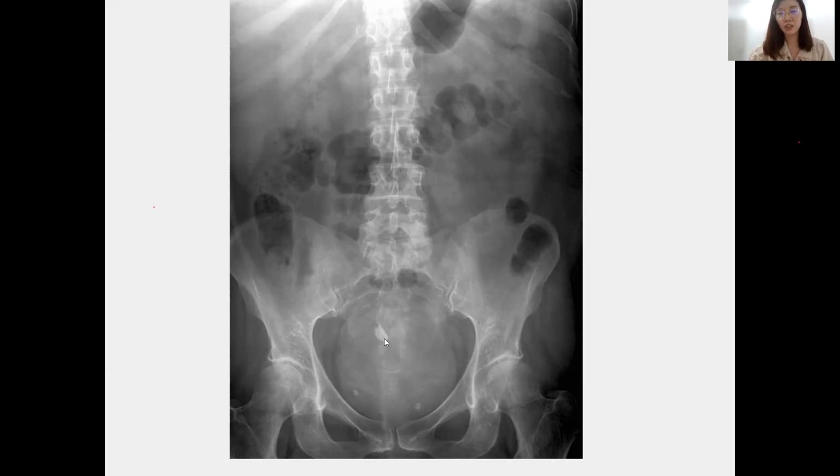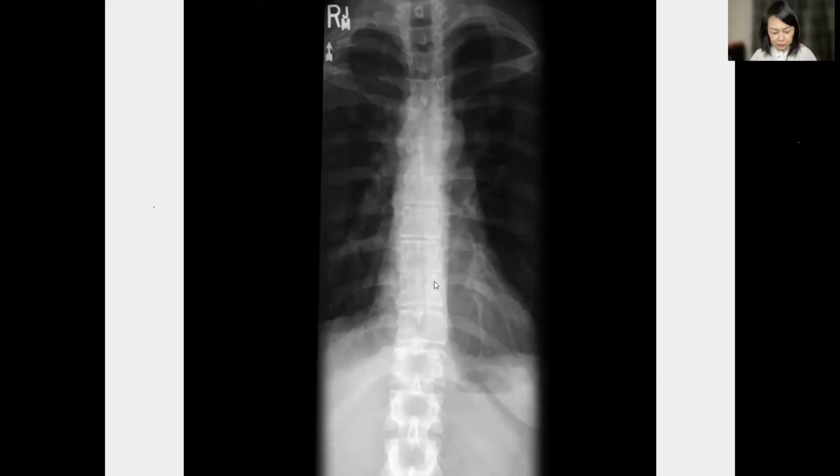Because the location of the ovarian teratoma is quite variable in the pelvis, the calcification or the tooth can occur anywhere. So when the shape of the calcification is a bit like a tooth, you need to raise a suspicion of dermoid cyst. Okay, good try. It's getting more interesting on Facebook because people are trying their luck also.